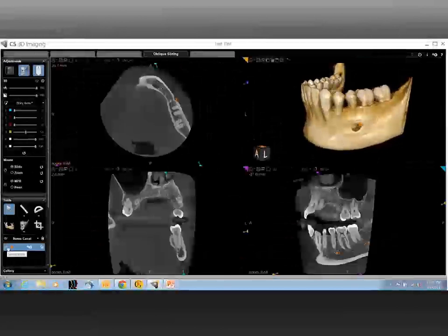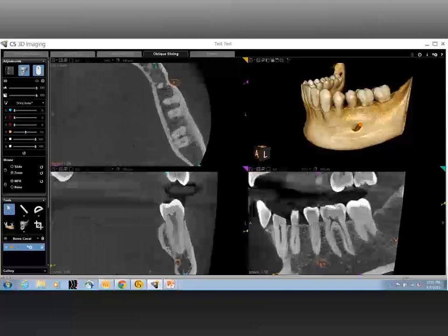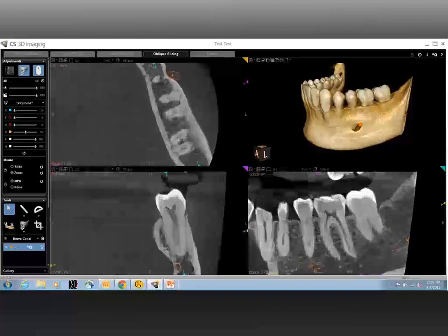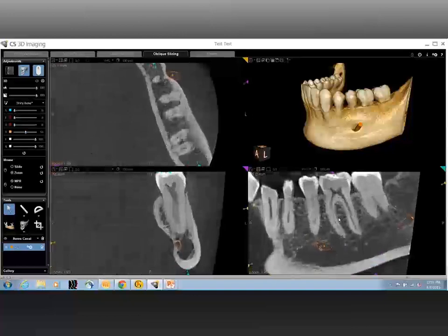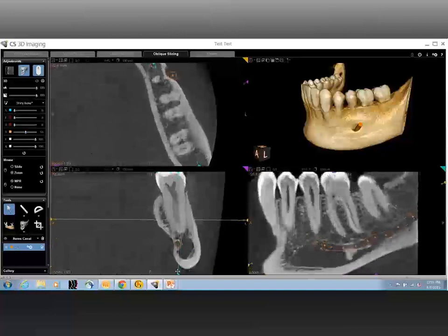Why do we scan a patient for endodontics? To identify the radicular anatomy. So the canals itself have to be evaluated, right from the pulpal horns to the apex, to the opening of the apex. You can clearly see that it has a good value in adding the third dimension to visualizing the canals.